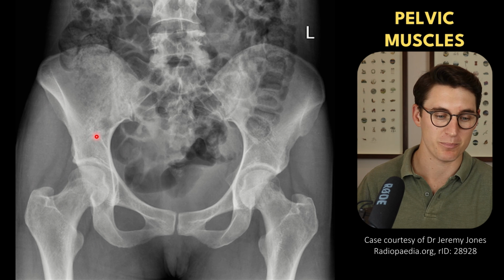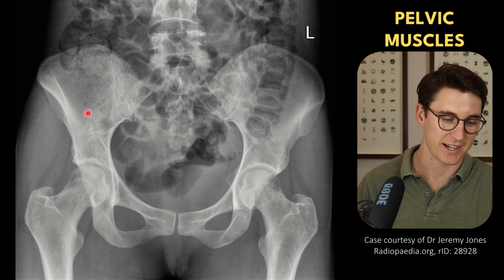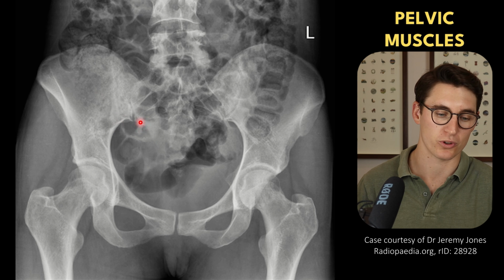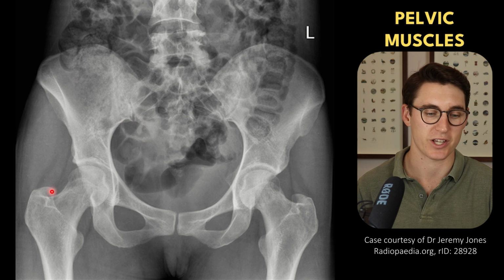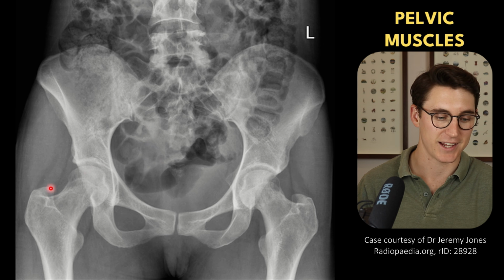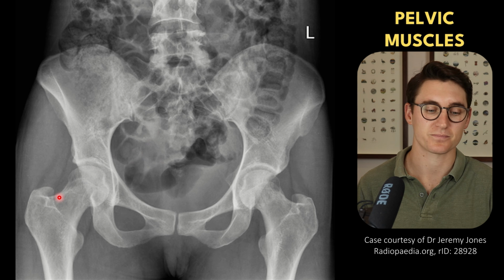We have our gluteus minimus and gluteus medius muscles that head from the posterior surface of these iliac wings and head down towards the greater trochanter itself. Inferior to that, we get our piriformis muscle, which heads from this lateral border of our sacrum posteriorly round towards our greater trochanter. Below the piriformis muscle, we have our superior and inferior gemellus muscles that head out and attach just below the attachment of that piriformis muscle.